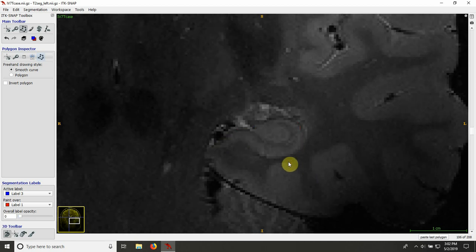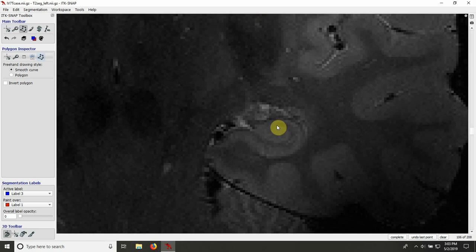So next slice, again dark band here. You see something here, I'm not sure which one would be the most correct. I think this is slightly more continuous with this upper part, so that's why I'm picking that portion. And again, you can see it a bit more clearly, but the SRLM is stopping at this point.